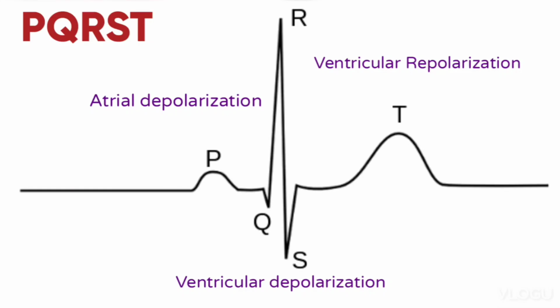And so that being said, atrial repolarization and relaxation takes place after the P wave, which can be found within the QRS complex. Now, as a review, the P wave stands for atrial depolarization. The QRS complex represents ventricular depolarization. The T wave represents ventricular repolarization, and the atrial repolarization is covered by the QRS complex. You cannot see it, but it exists.